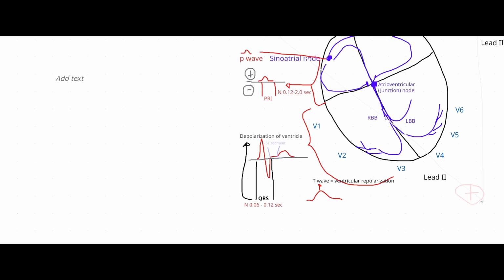Above the line, positive energy, very strong. But this also tells us whether there's an infarction, an ischemia, or infarction. Okay.